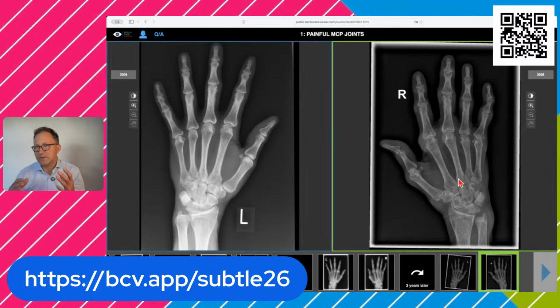you say you have a patient with osteopenic MCP joints, in my opinion, this is not sufficient to raise the diagnosis of rheumatoid arthritis. It's too weak. I would need a different pattern, like some small erosion or some cystic changes that are, in my opinion, much more helpful than osteopenia close to the joints.